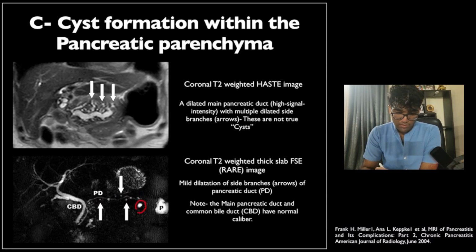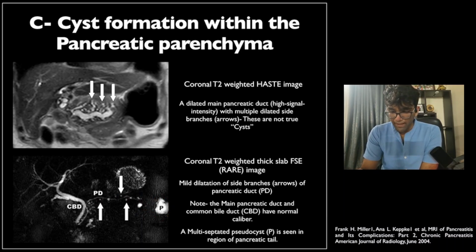However, this cyst is unlikely to be a dilated side branch, and this is a pseudocyst from a previous episode of pancreatitis. So that's a multiseptated pseudocyst.